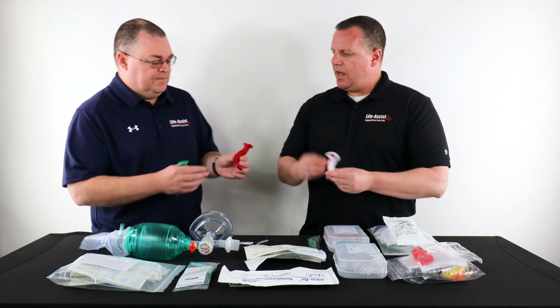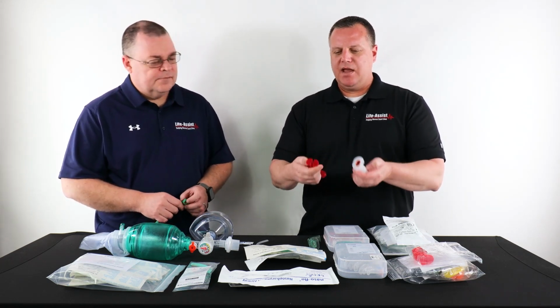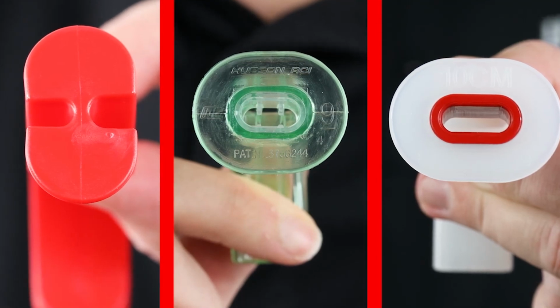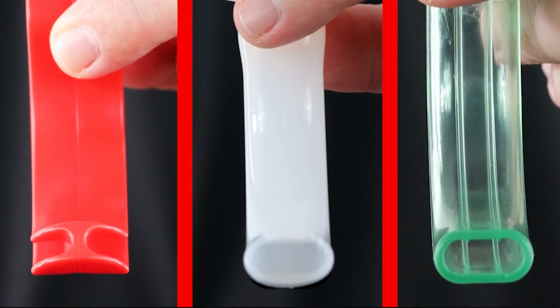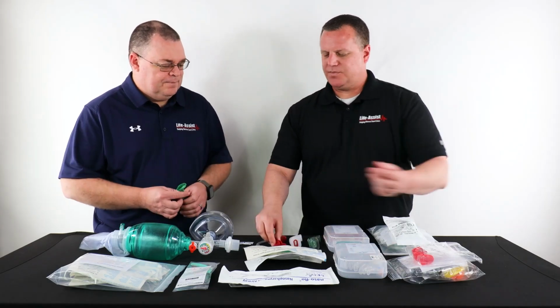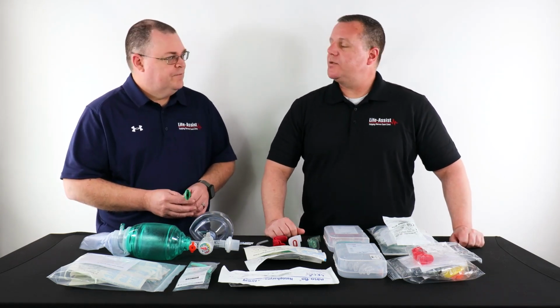So when would you use this one over this one? They look completely different, right? These are basically pretty much the same thing. They're just manufactured a little bit differently. But it's still going to allow a channel or tube to get air into the lungs. Whatever the department likes. It's not really different uses, it's just a different design. Yep, it's going to accomplish the same thing.